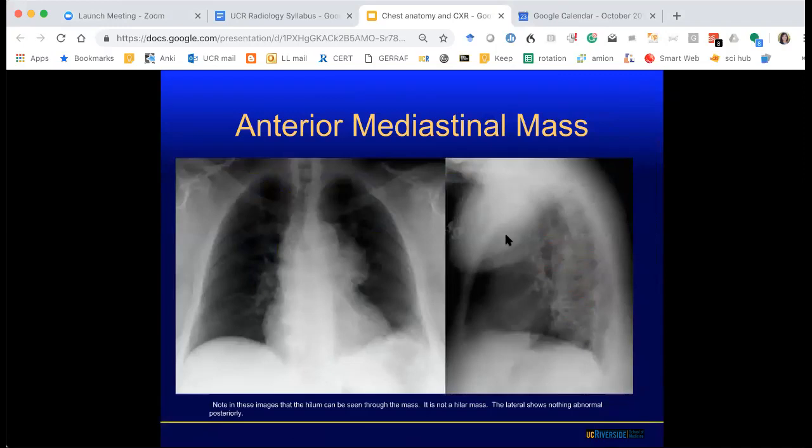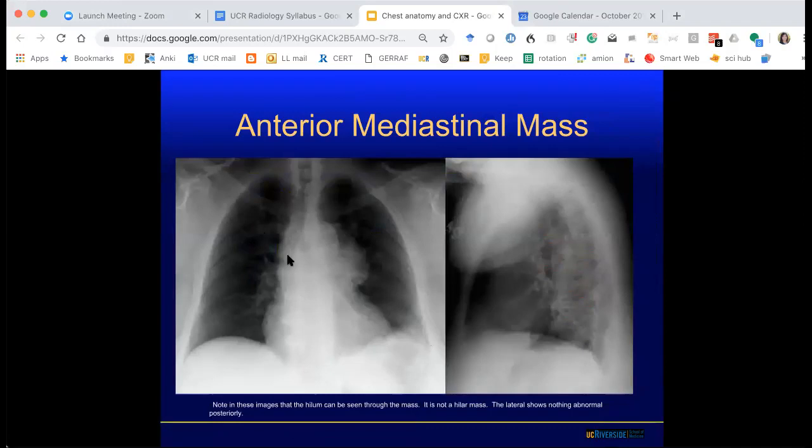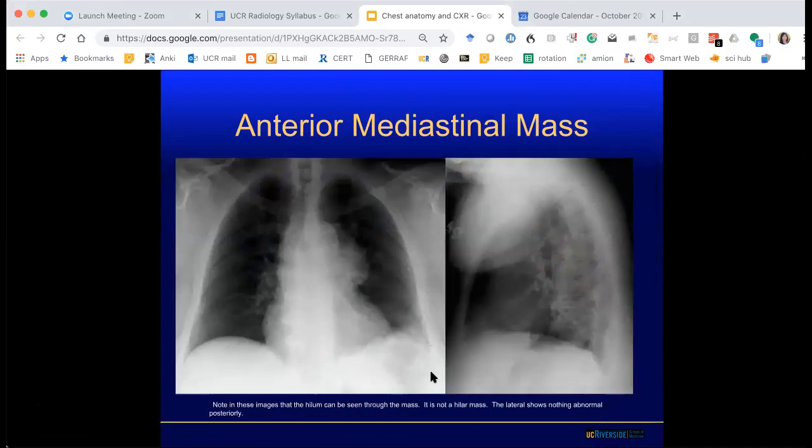Okay, what about here? So no lines and tubes, there's none. Lung volumes look okay, it's not too bad. And then you look at the lungs and pleura, the right is fine. The left, though, what do you think about the left? Or what's going on here? Any guesses?